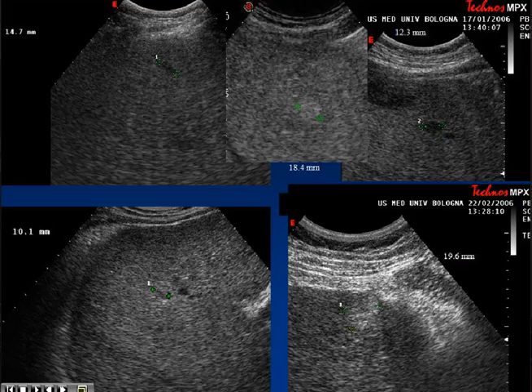So we skip now to the other setting. These were the patterns in healthy liver. Washout is the key feature. The late phase is the key feature. Hepatocellular carcinoma probably is the most tricky situation, but we will expand this now.